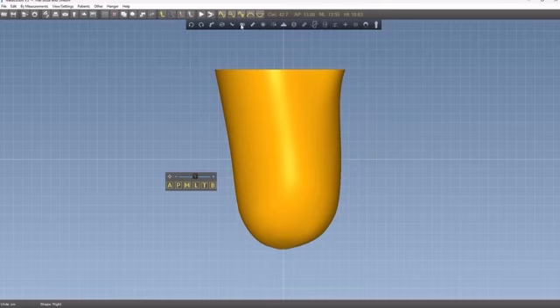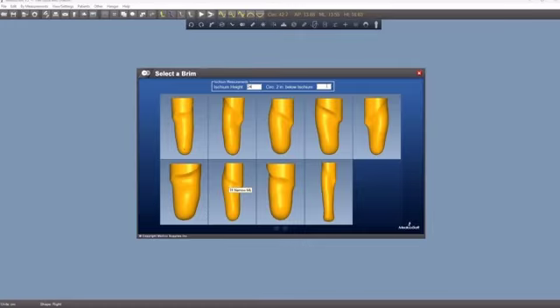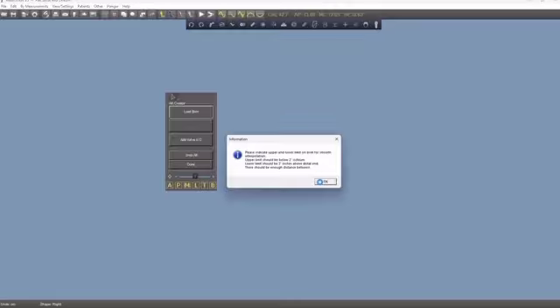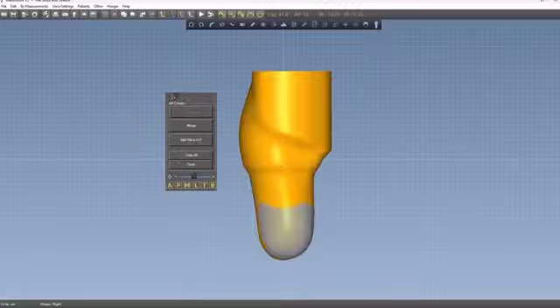You go to AK builder and you say load the brim, and I choose a brim that I'd want, and I've got to enter the measurements, of course, 24 in length, and 2 inches below I'm putting in the similar measurements, and I choose the brim. Okay, and now it's just going ahead and resizing the brim for us. So at this point we have the two pieces together, right?